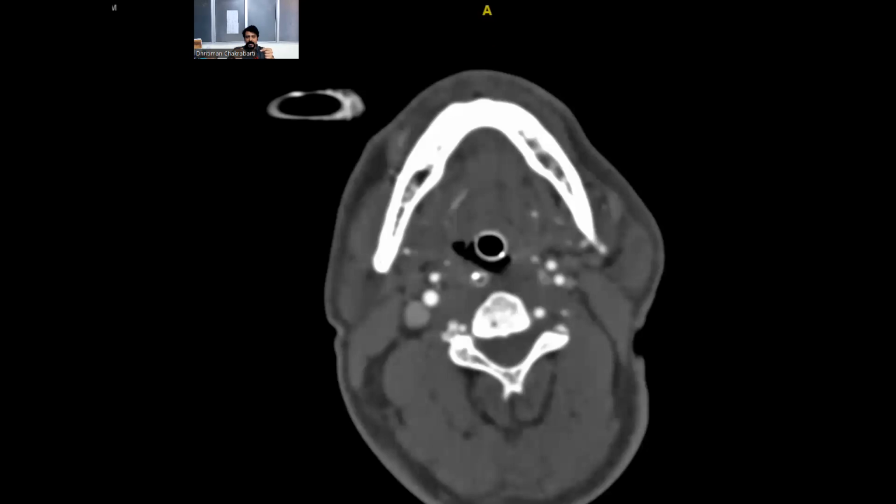In the other, more detailed classification, there are lacerum portion and cavernous portion separately. Here, the cavernous and clinoid can be said as one segment. You'll be able to see it as a loop going anteriorly, then coming back posteriorly. After that comes the terminal segment of the ICA, from which you'll have three important branches.